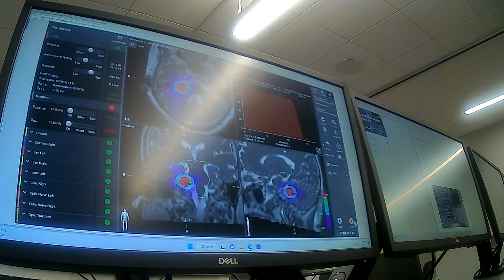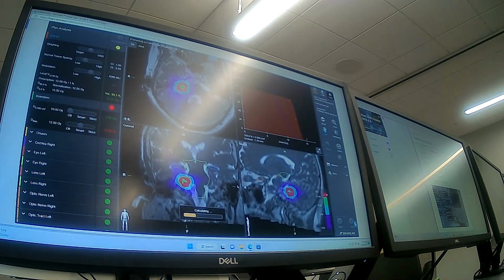Especially since, at least in this plan, they are right up against each other. They have to use their subtraction. It doesn't work. There's no way it's going to work. I mean, you can't get both during that set criteria. So you could ask the physician, and it would be their driving decision to say, yes, change this or this.